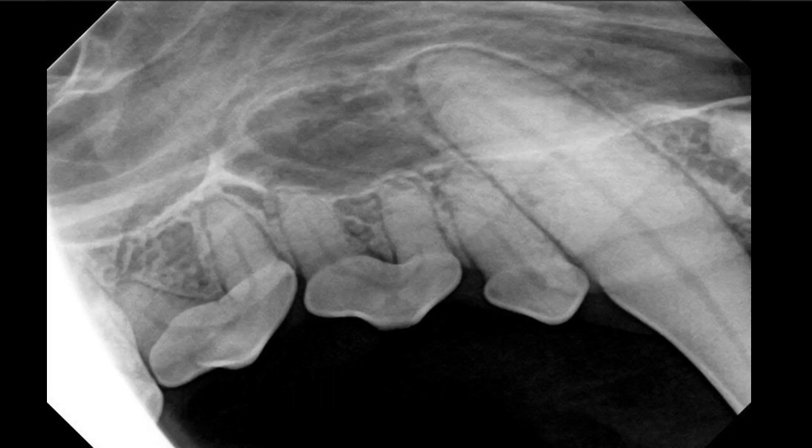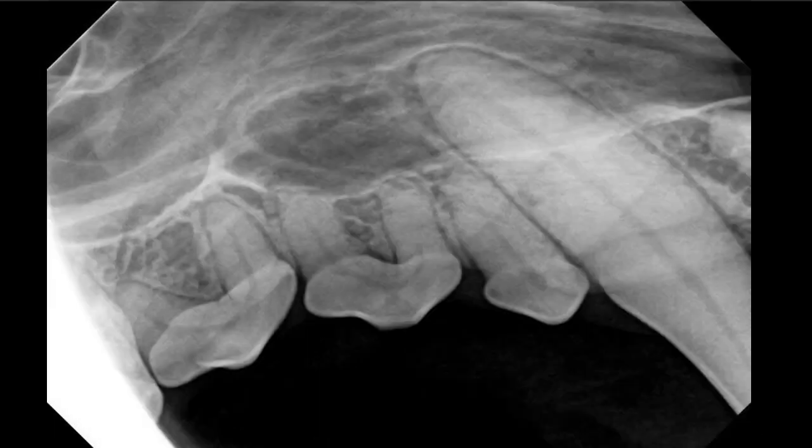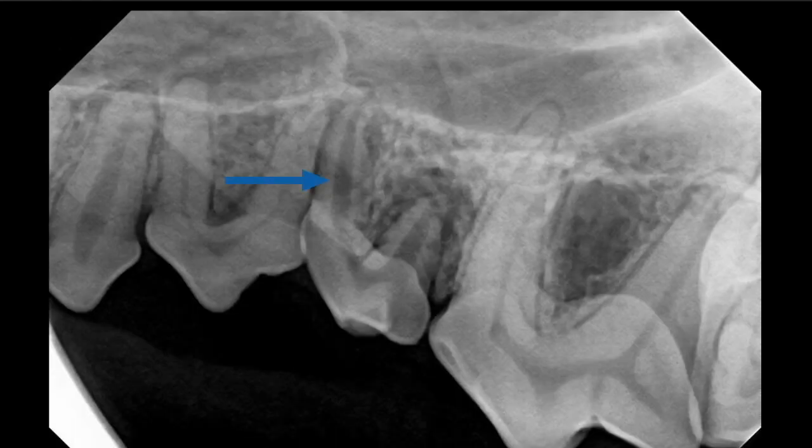In this case, we also have, if you look at the root to the right on the tooth, not the one where the arrow is, but the one to the right of that, which is a distal root on that third premolar, you definitely see that lucency around there. And that, in addition to the changes that you see around the other root where the arrow is that are not so blatant, are the reason why you have a lesion. The tooth has died, and the necrotic pulp has infected the bone, caused inflammation and destruction in that bone, and then that inflammation and infection gets past the bone and into the soft tissue, and that's where that lesion came from. Look at the other side to compare and see that that's perfectly normal versus this side where you've got all those changes.